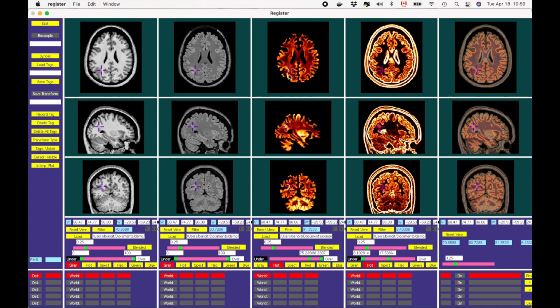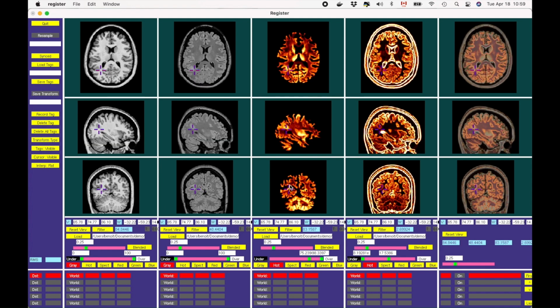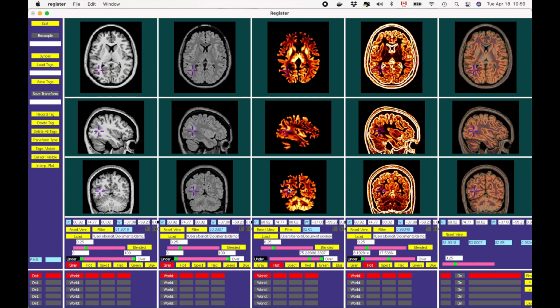Here, for example, in this area, you can see that there is a relatively higher relative intensity, which you don't see symmetrically on the left. And you also notice that the gradient looks much lower compared to the rest of the surrounding areas. To confirm, what we can do is look at the other views. And it looks like this is also the case here. A higher relative intensity and a lower gradient.